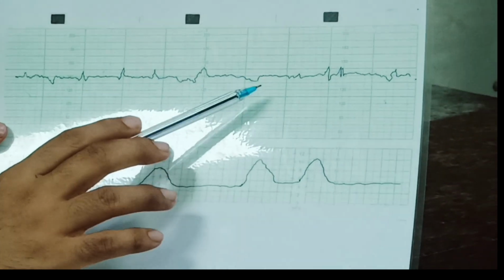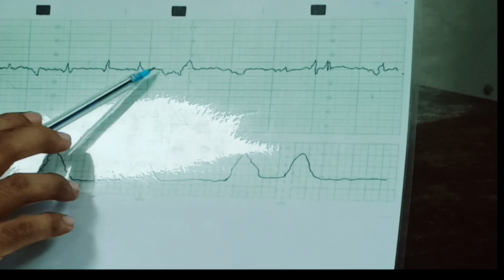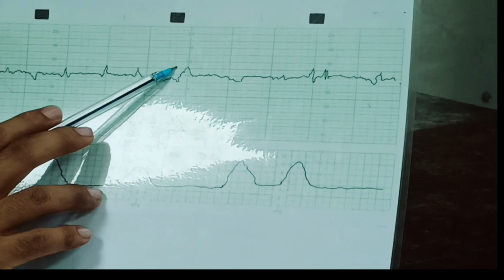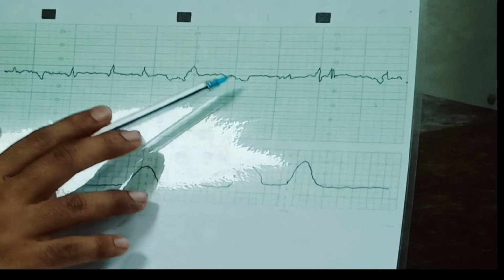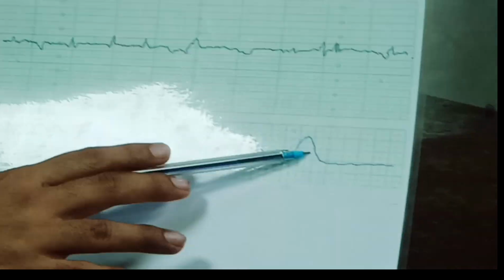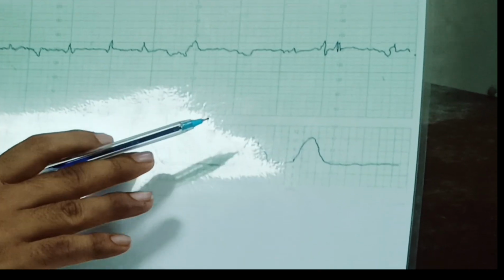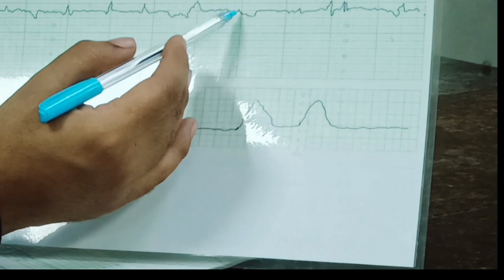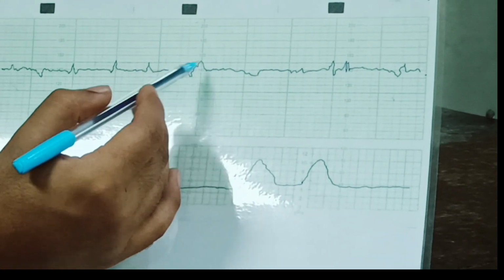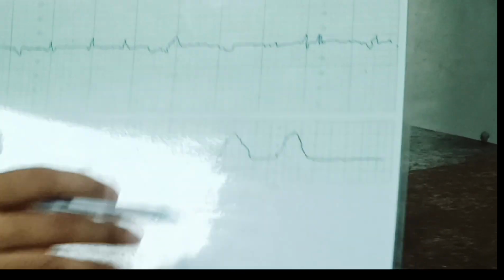This is a cardiotocogram showing a baseline fetal heart rate of 140 beats per minute. Variability is around 5 to 10 beats per minute, that is also reassuring. Then there is 1 acceleration and there is no obvious deceleration. Then come to contractions. There are moderate intensity contractions, 4 contractions in 10 minutes. It is a regular contraction. So the patient might be in active labor and the CTG trace is normal. It is normal because baseline is reassuring, variability is reassuring, and no obvious deceleration is also reassuring. So it is a normal CTG.